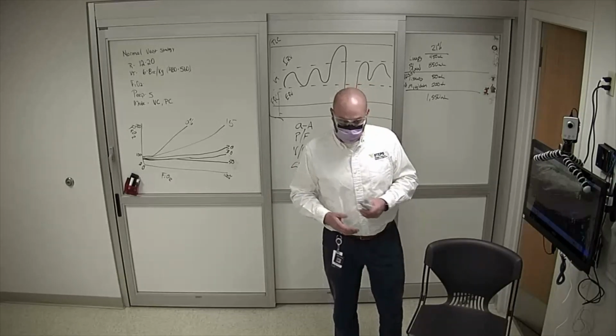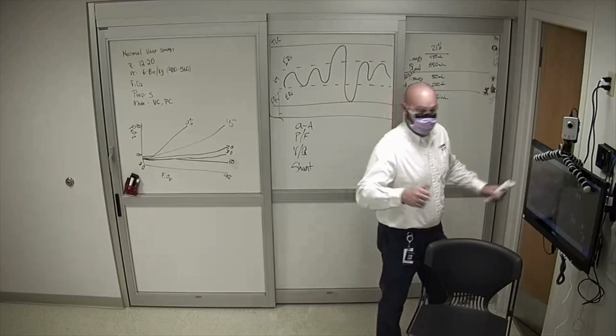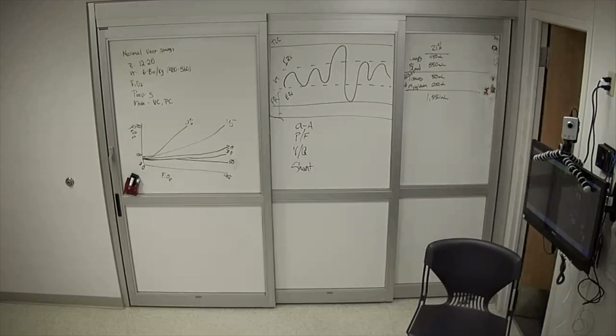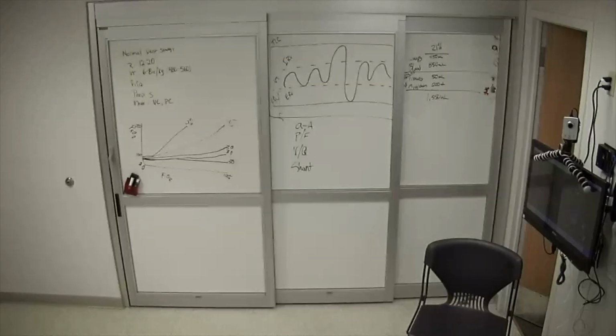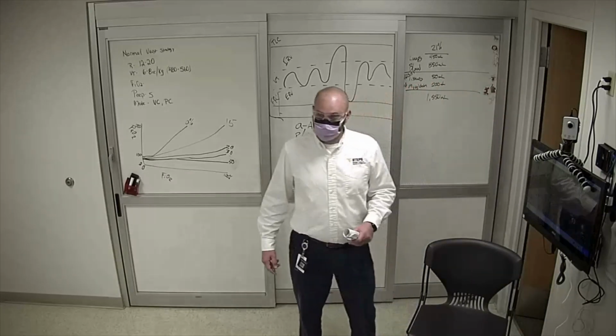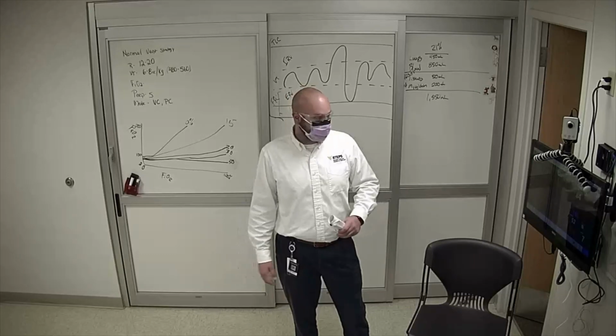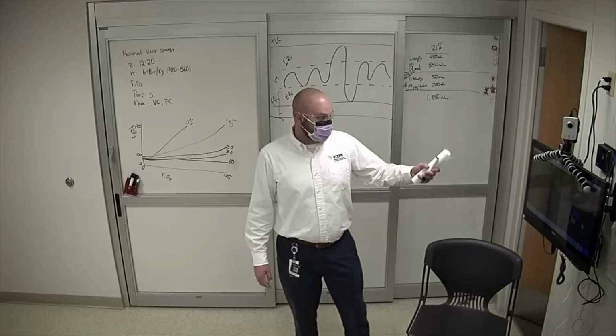So let's do that. Instead of hitting the O2 breath button, Shannon, just turn that up to 100% so it'll last a long time. Warned us at 60, didn't it? Wait, you sure you want to go that high? Maybe we shouldn't go that high. Okay, so we turn Stanley up to 100%.